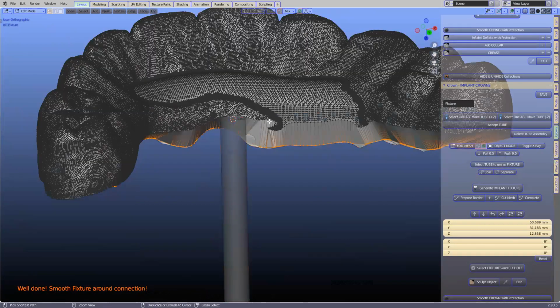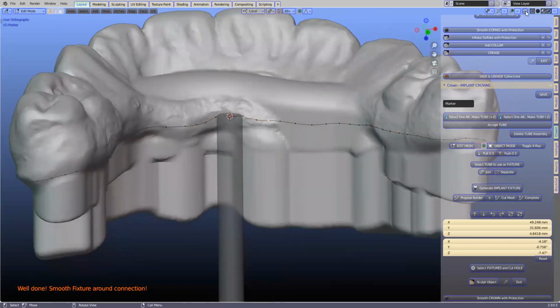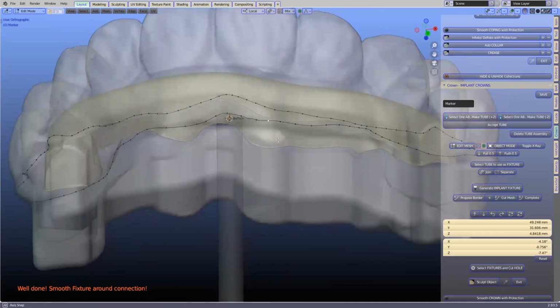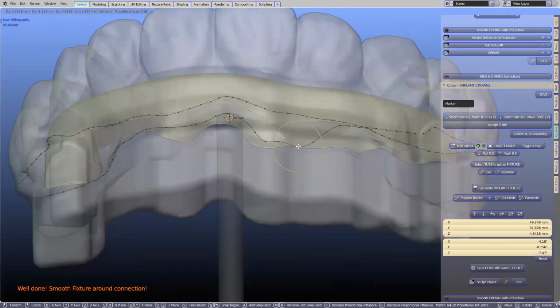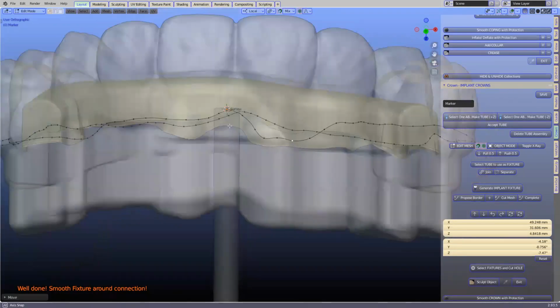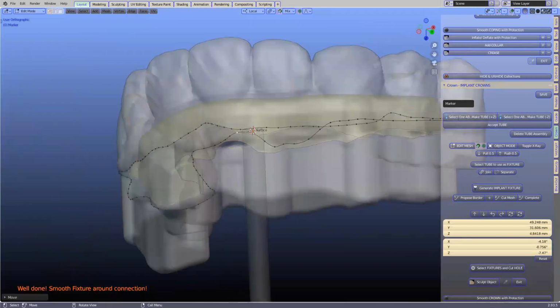So here, I'll just go over here because it's a little bit high up. In transparent, we can actually see where that is. So here, let's pull this down a little bit to make it a little bit less of a jump. Oops, like that. Here as well.